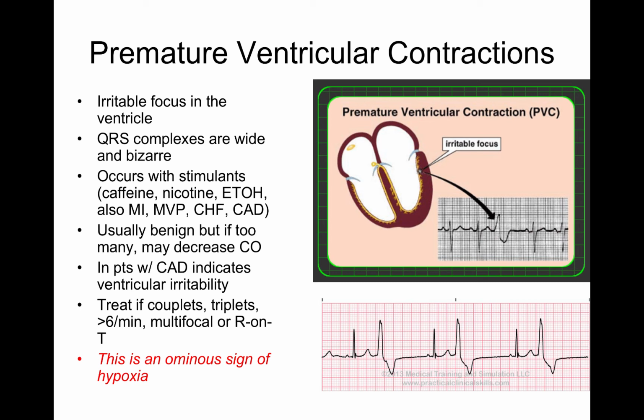What we do worry about with the presence of bundle branch blocks is in heart attacks. If we have a new block formation and they have chest pain, that is kind of like, uh-oh, they're probably having something going on. The next thing we're going to talk about is premature ventricular contractions. PVCs are fun to look at on the EKG. They are cool, but we also have PACs, the premature atrial contractions, originating at the top portion of the heart. Not really bad, because it's just stimulated, but we still got 2 other strikes before we're out.